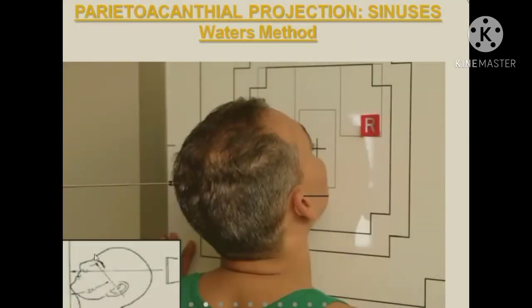Hello everyone. In this video we are going to talk about X-ray of nose and paranasal sinus, and here we will talk about Waters view. In this case the X-ray beam is directed from behind, forward, and the nose and chin touch the screen.